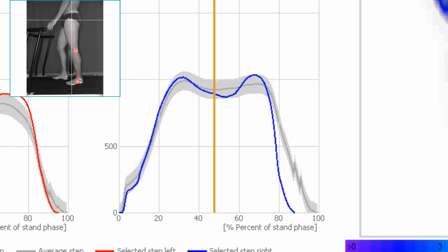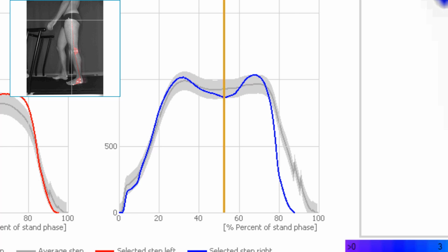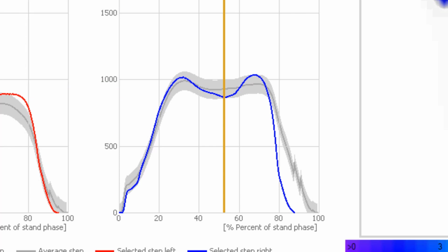Through the tibial forward movement, the heel pressure slowly begins to decrease and transitions into concentric activation of the plantar flexors. This is the change from mid to terminal stance and is equivalent to the moment when the bottom of the force curve has been passed. From this moment, the force curve experiences its second increase caused by the increasing contraction of the plantar flexors, which reaches its concentric maximum at the end of the phase with the second maximum of the force curve.